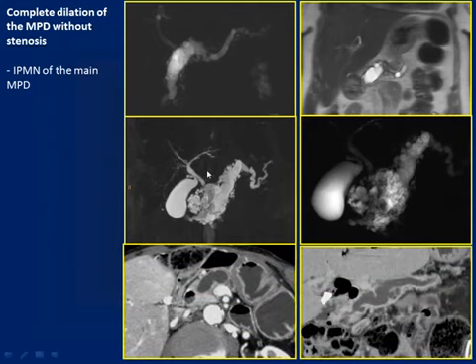I usually show cases of MR when concerning IPMN of the main pancreatic duct, but I want to point out that also CT can show dilation with uniform margin with associated dilation of the side branches, representing a case of mixed IPMN of the main pancreatic duct.